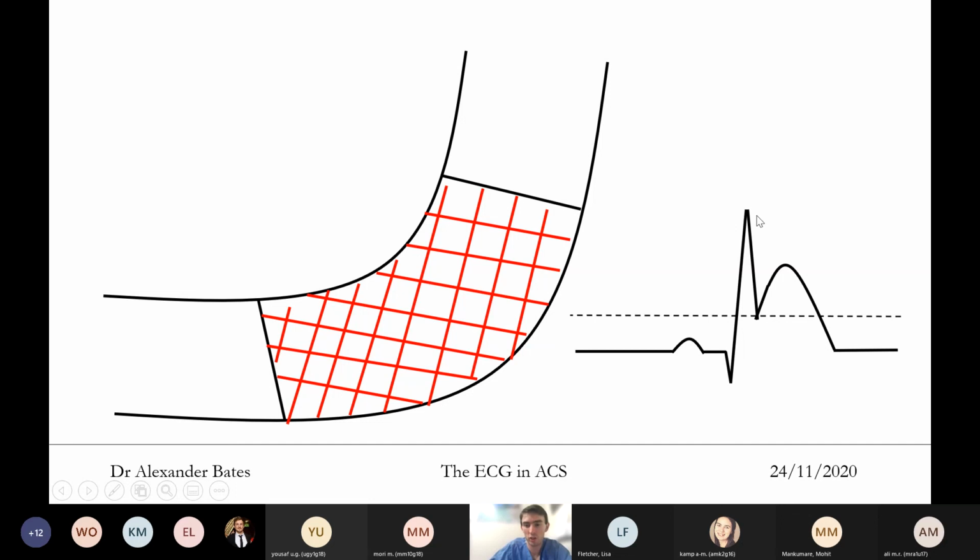Then you have depolarization of the ventricle. It then occurs, again you get a QRS complex, and then the isoelectric line, now everything is in a depolarized state, goes back to what is the original isoelectric line, which is elevated in this circumstance. And then you get repolarization and everything's back to normal with the infarct still there, which has got a lowered isoelectric line.